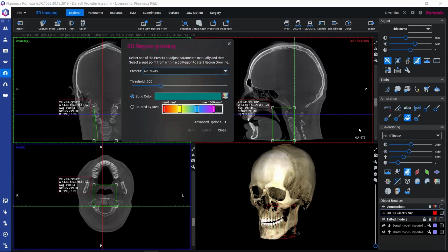And like we see in the lower right corner, the Hounsfield unit value, that is the relative tissue density here, is something around minus 800 or so. When we click a point and select that as the seed point, in the actual segmentation process, the software will use this 300 as a threshold in determining what everything will be included in the segmentation.